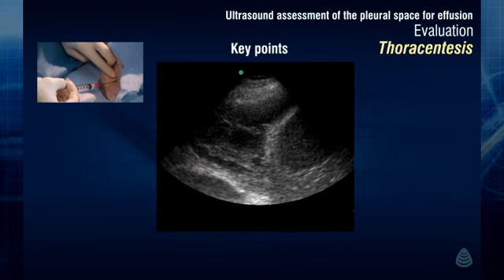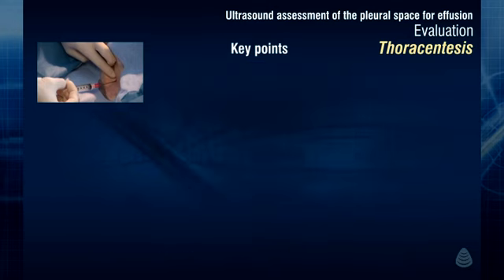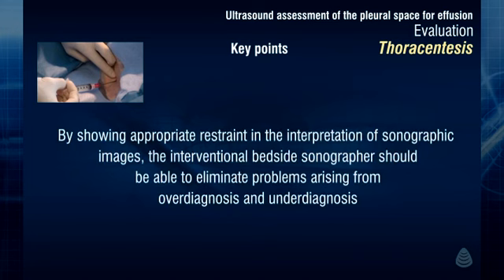Also, keep in mind that some small and/or loculated effusions would be better drained by CT scan as opposed to ultrasound guidance. By showing appropriate restraint in the interpretation of sonographic images, the interventional bedside sonographer should be able to eliminate problems arising from overdiagnosis and underdiagnosis.